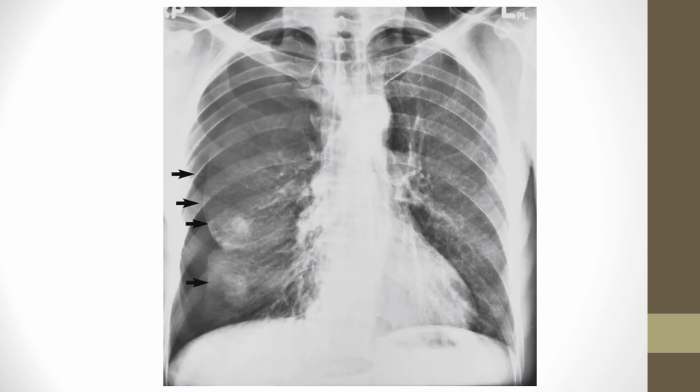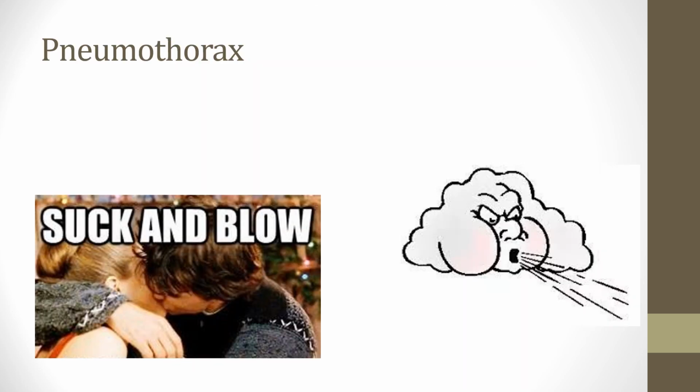So what do we see here? Here's an example of a pneumothorax in the right lung. You can see the pleural line, and those arrows are pointing to it, so you don't have to have me draw all over this one. And you can see the lung is sort of collapsing in towards the hilar area. Remember, your lungs are introverts. They always want to go in, stay inside, right? So that's where they naturally want to go. And that's where you see that delineation. You can see that border pretty darn clearly there.